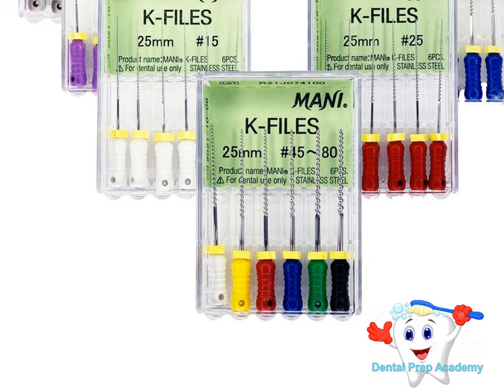So you need to look clearly whether it is 45 to 80 number or 15 to 40 number. You have to look at this carefully. Now this one is available in 25mm length as mentioned on the packet.